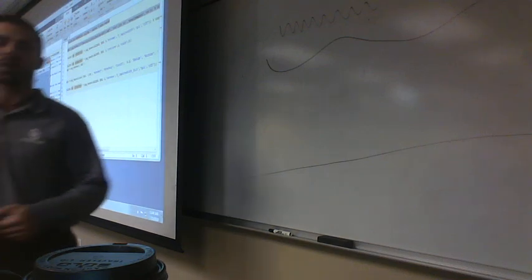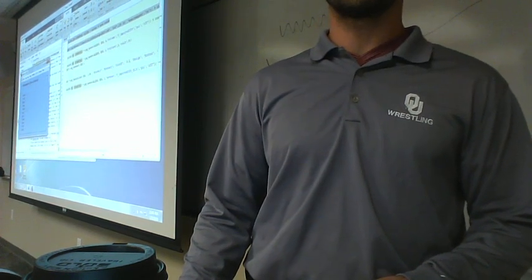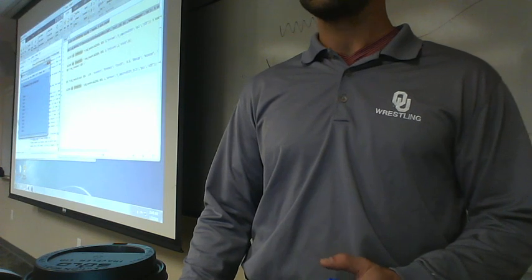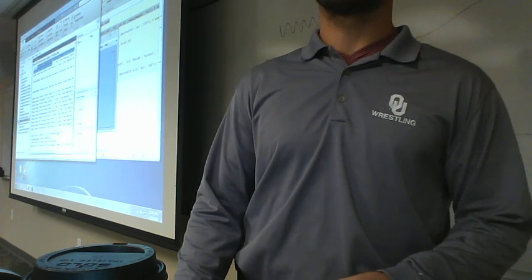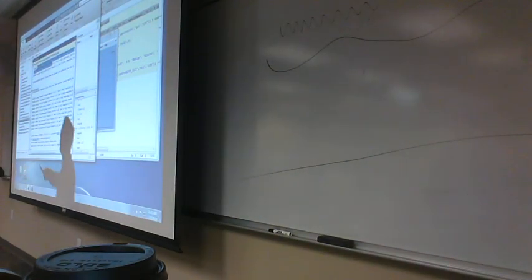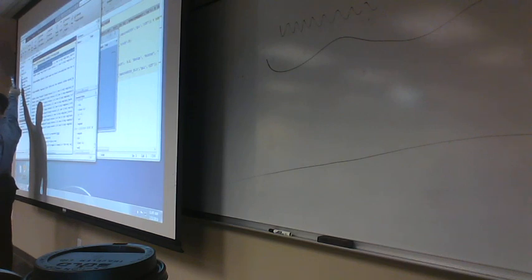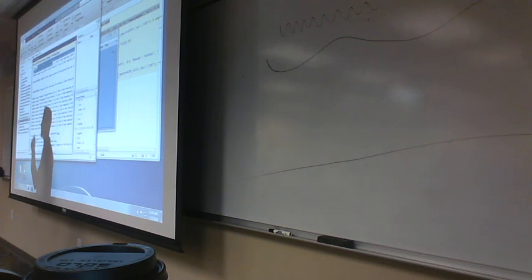If you look in our window on the left, over here, where our current folder is, we can see that there are all these files, right? Now, we started with a BDF file. That's our raw data. Once we've imported it, we'll never use it again, because it's way too big and way too slow. Look at how long it's taken to even work with this. We need to get fast.